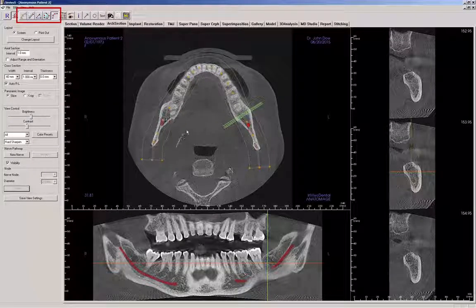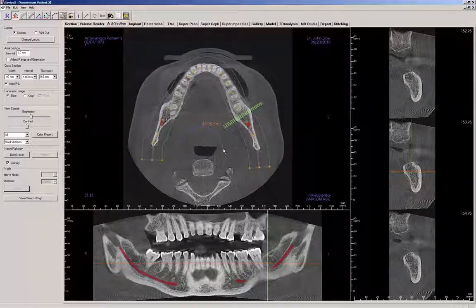The second new measurement tool is polygonal measurement. When this tool is selected, you may mark an unlimited number of points on the volume. The distance between the first point and the last point will appear. Right-click your mouse to indicate that you have marked your last point. Clicking on the point and moving the cursor can modify the points and the distances. Slice capture mode is a utility used with the Report View tab and optional module.